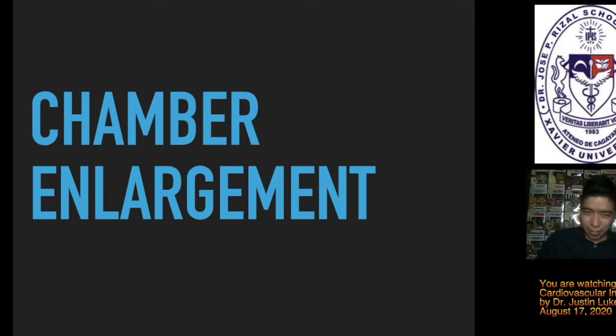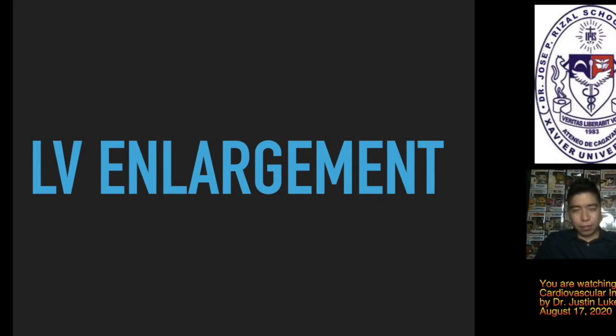So now let's proceed with chamber enlargement. So first, let's go to the most commonly enlarged chamber in the heart, which is the left ventricle. In typical cardiomegaly, or in most cases, it's usually the left ventricle that's prominently and obviously enlarged on chest radiograph.